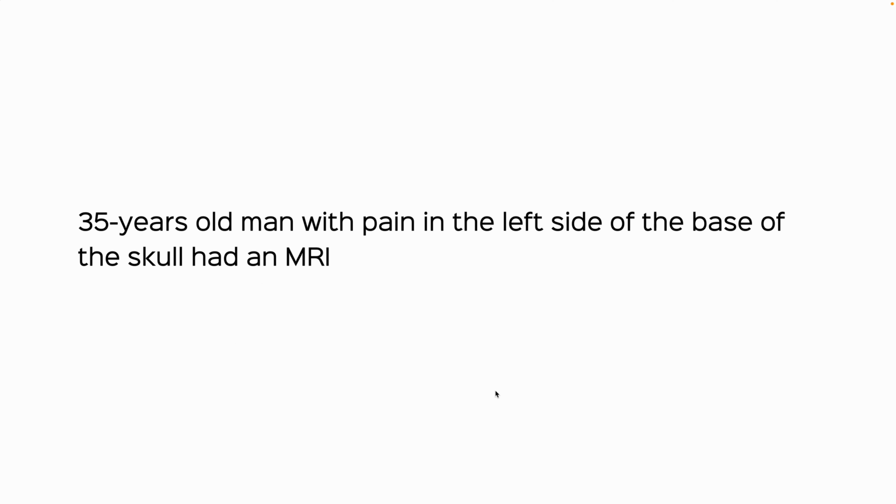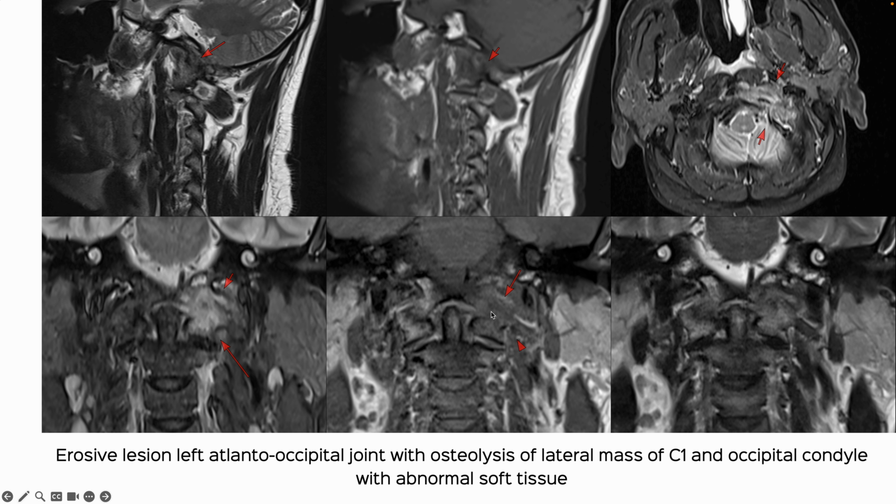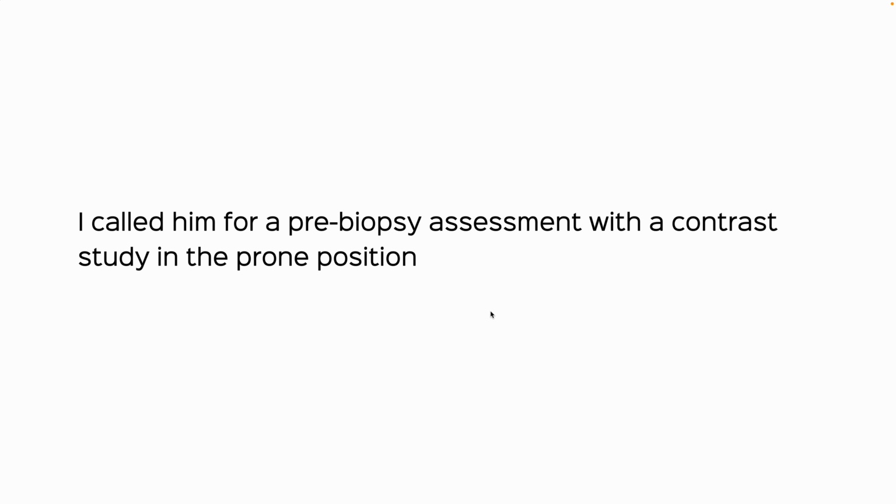So, this was a 35-year-old with pain in the left side of the base of the skull, had an MR. The MR showed a left occipito-atlantal erosive lesion. It is an arthropathy, and typically this would be of infective etiology. There was no other study done, and the patient was sent for a CT guided biopsy.